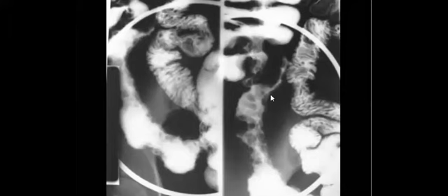I think Crohn's is one of the good differentials to mention, cobblestone, especially when it is concentrated in the terminal ileum. So lymphoma as well. Yeah, it can be cobblestone of Crohn's. And maybe what do you think about this?